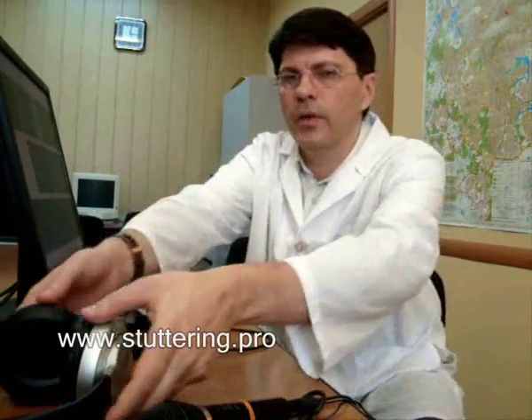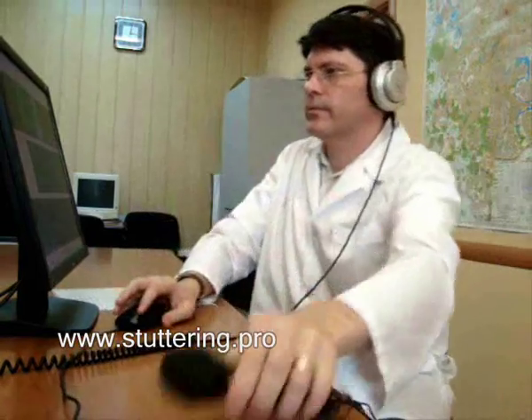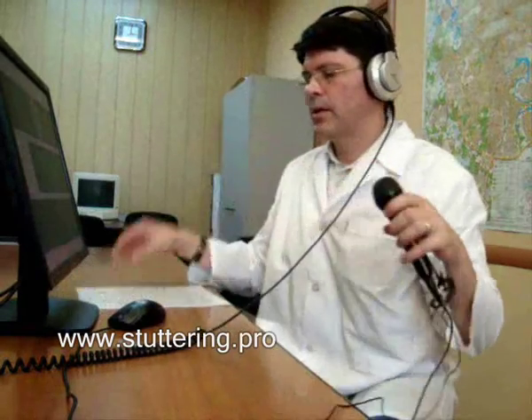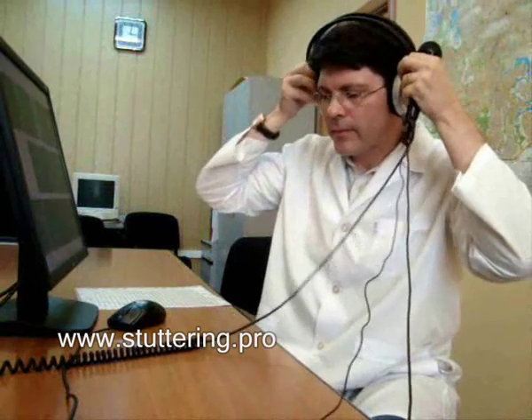To be able to work with the program, you should only use two buttons, start and stop. After pressing start, you should start reading a text. Later, you'll be able to have a slow conversation, but first just read, in order to get used to the program, to the fact that you follow the earphones. You will have a new sensation that you are speaking not the way you want to, but the way it should be done. I'll show you how to work with the program so that you can see how it should be done and not be shy about it.